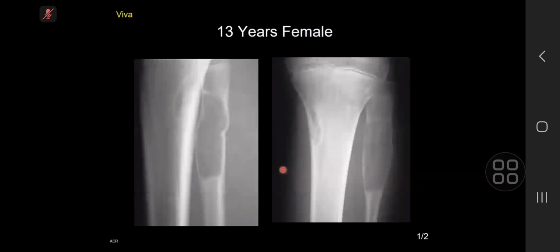And again, in the tibia proximal diaphysis, I can see another lucent lesion with a sclerotic margin, and again, a narrow zone of transition. So the lesion in the fibula, given the intramedullary location and a narrow zone, I'm thinking is a simple bone cyst. And the lesion in the proximal diaphysis of the tibia appears to have some calcification within it.